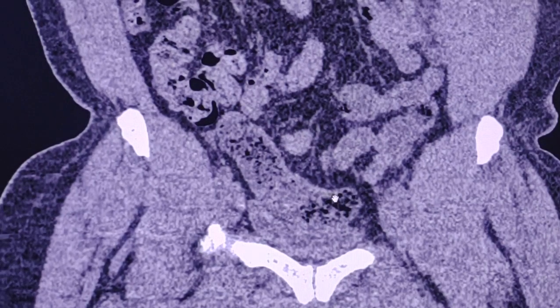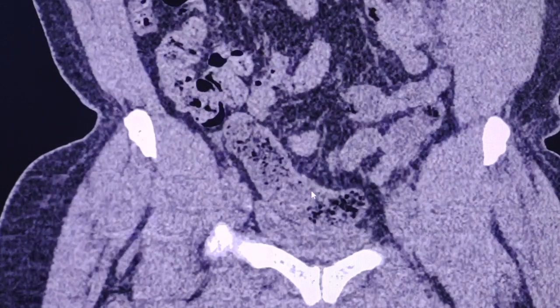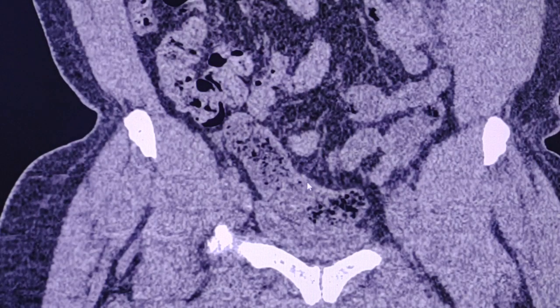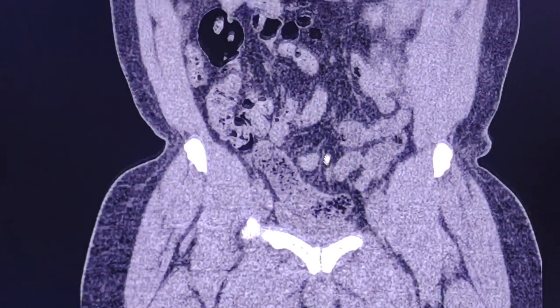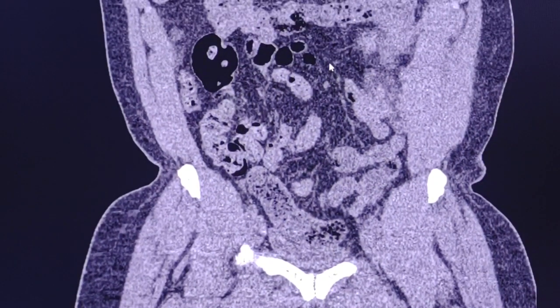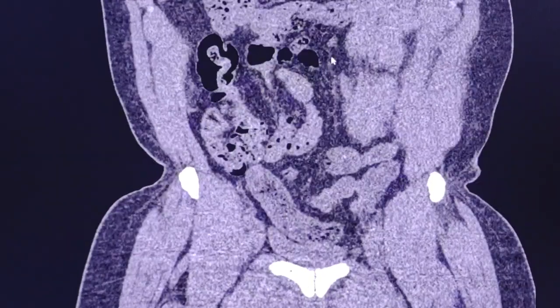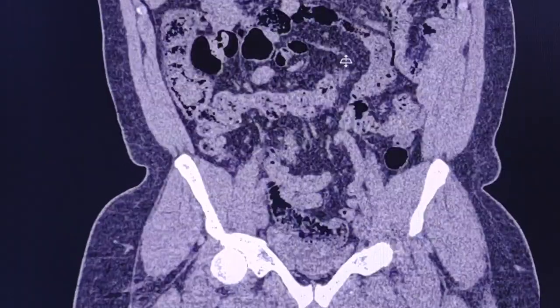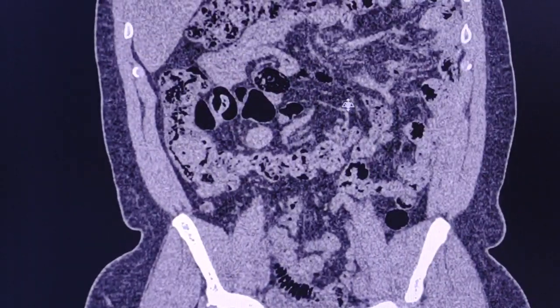As you can see in this image, we can see that there are some mural changes in the small bowel. There is some thickening, and apart from this, there is a generalized mild blurring of the mesentery. This is reactive.